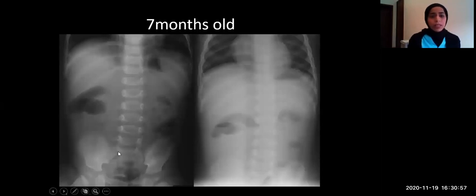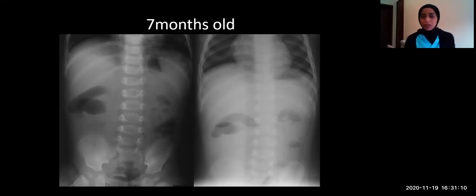So instead of distension, there is a paucity and very minimal gas seen within the abdomen of this pediatric patient. Distension is a worrisome feature, and paucity of gas in the pediatric abdomen is also another worrisome feature for underlying bowel obstruction. Whenever you see abnormally distributed gas within the abdomen, paucity or overdistension, both are alarming features.